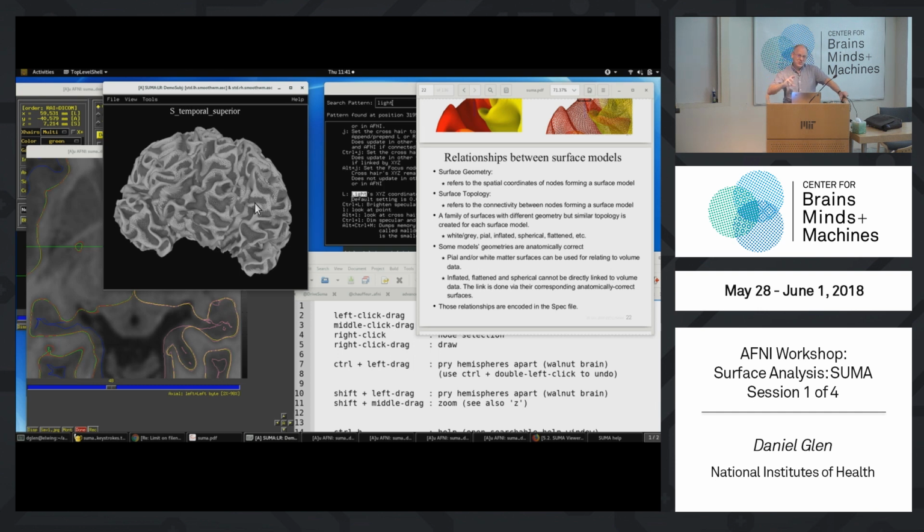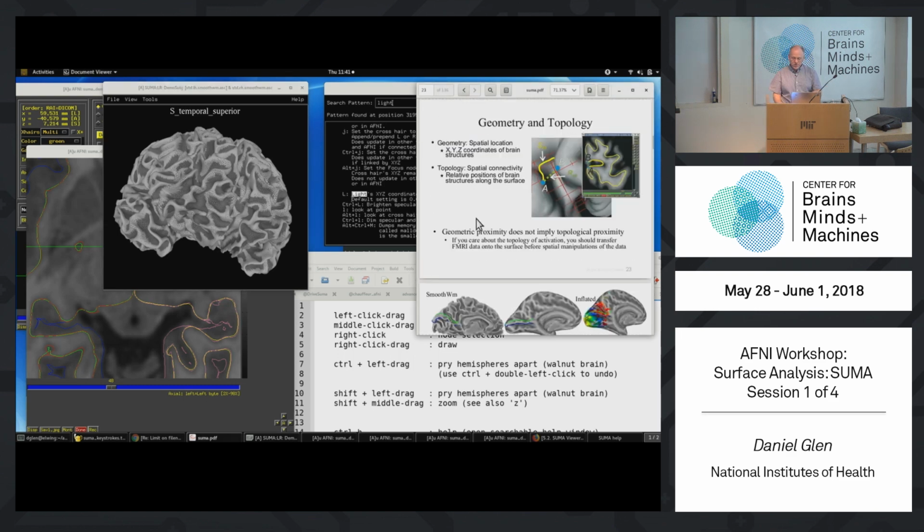You could potentially do this volumetrically, then generate surfaces from that and look at one surface at the same time over the other one. It's a bit tricky and a little confusing, but you can do it. I think that's probably a more advanced topic that we'll have to talk about. But yes, you can show pretty much as many surfaces as you want. And tomorrow we'll look at hundreds of surfaces all at the same time. We keep all this information.